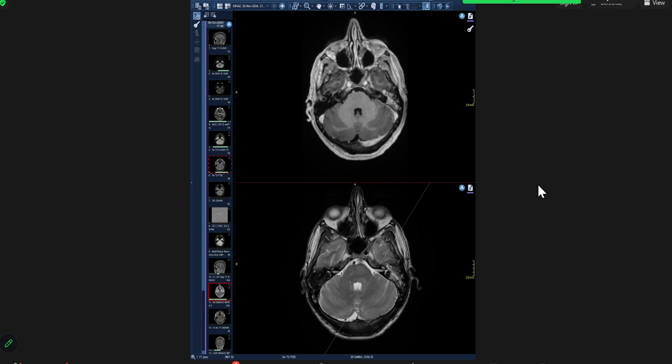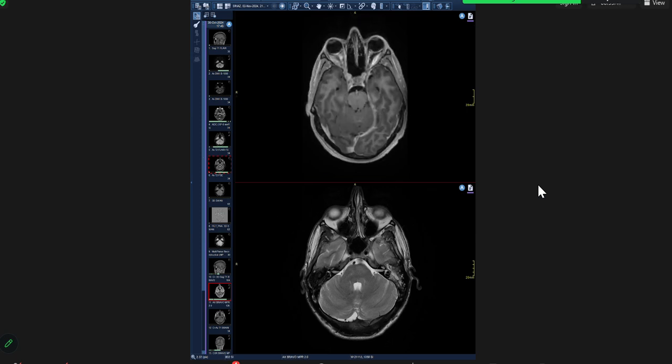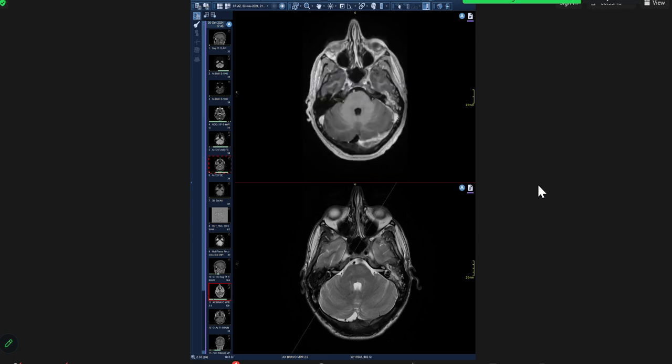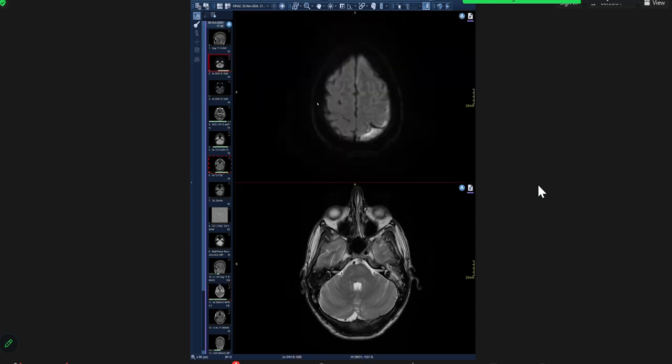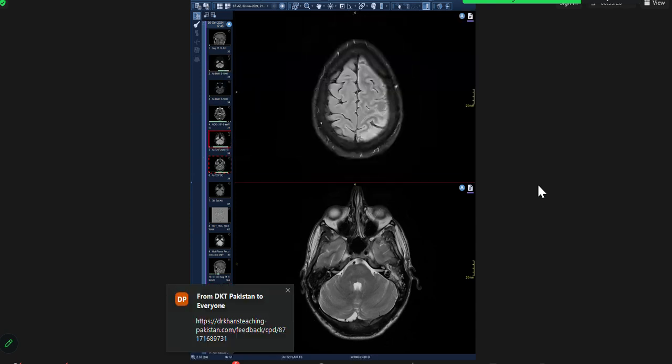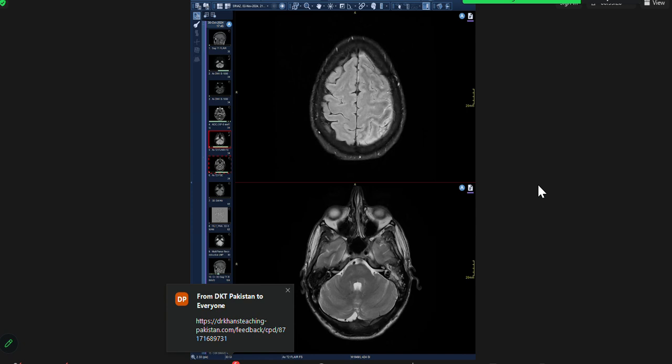So the cause is on these images. I showed you this because he has severe mastoid effusion. Ma'am, I appreciated the mastoid effusion, but I could not relate it with dural enhancement. So mastoiditis is causing his meningitis. I just ignored it in the first image. So there are some important things in this particular scan which everyone needs to be really, really aware of.